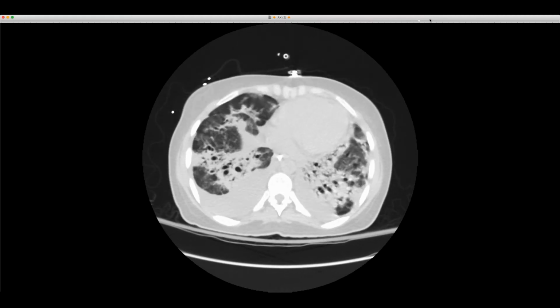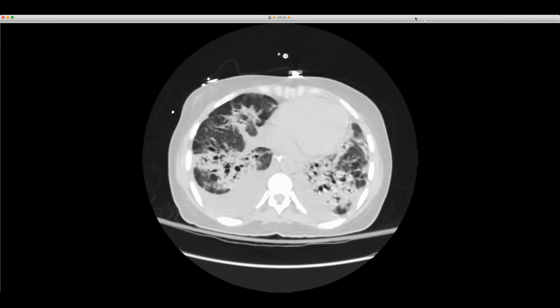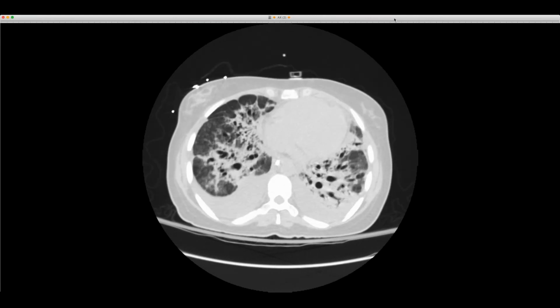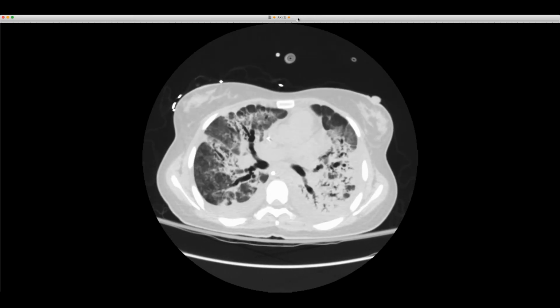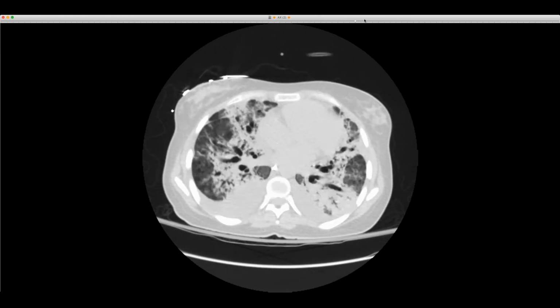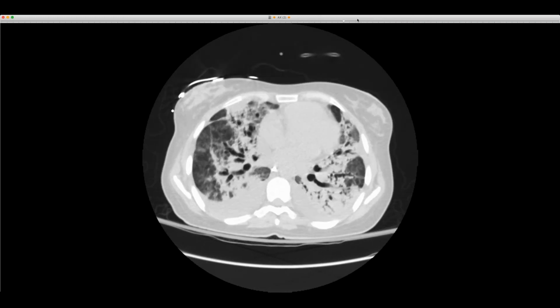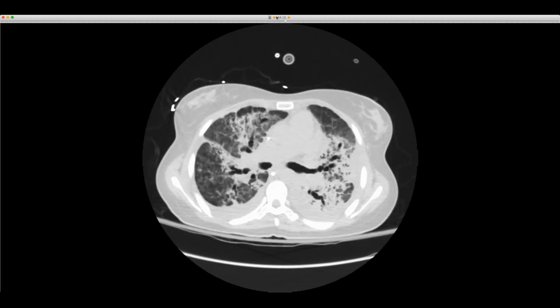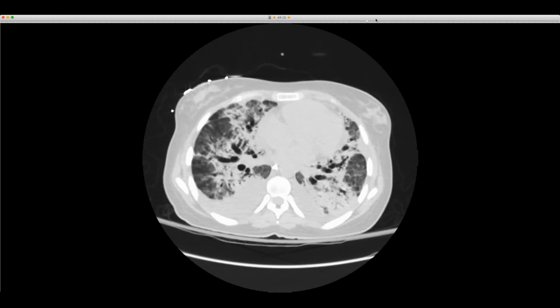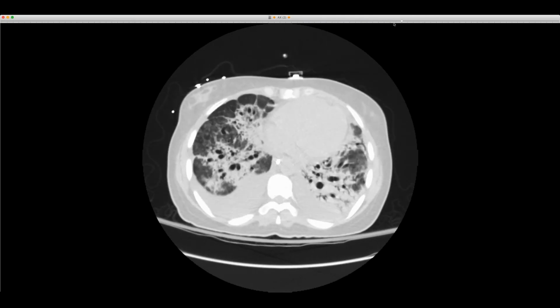So you have a ton of bronchial dilatation, and you have consolidation, and certainly she did have pneumonia. But in my experience, and a lot of the literature suggests this too, when you have so much varicoid bronchial dilatation in the setting of this pattern, it suggests ARDS, and this went back to normal almost completely, which we've seen a lot in ARDS. So that's why I was invoking it, and clinically she had ARDS. So I don't know. That's interesting.